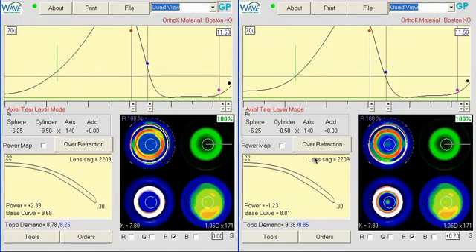This is an orthokeratology case where the patient's a slightly higher myope and is getting flare and glare at nighttime. And this is the original lens, and we've proposed a second lens for the patient. With a -6, it's going to be tough, especially with an adult, to not get any glare.